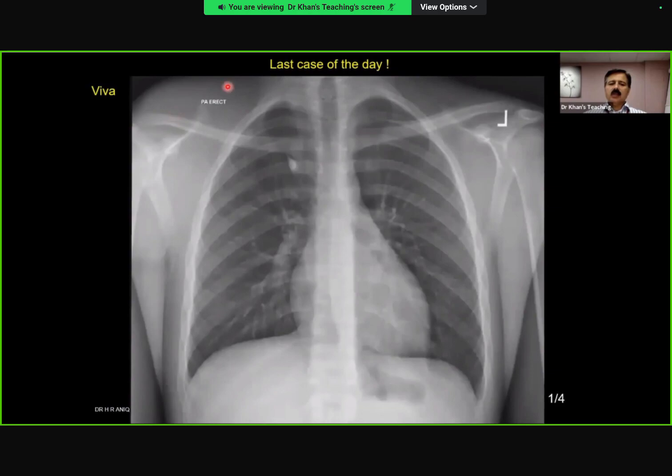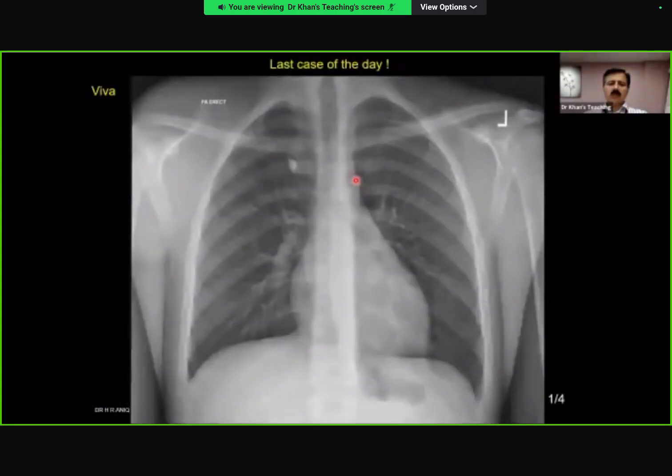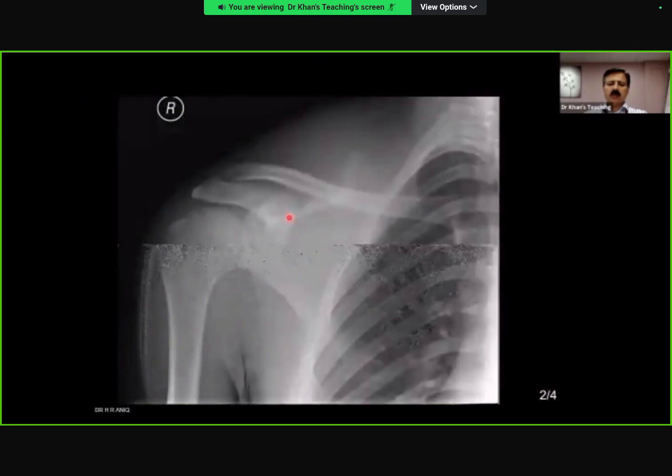And then you see this scapula versus this scapula. So there is something happening, a bit of permeation, expansion, or destruction, whatever. So once you pick it up, I'm showing you a close-up, there is a bit of a technical problem in here. But just to make the point that this is that soft tissue, and here was that bony destruction. This is too easy, of course, but here it becomes a bit difficult.